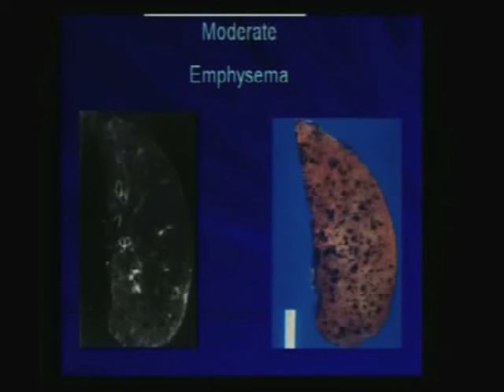And this is a case, for instance, where the patient passed away, and the chest actually looked normal. But if you look at the specimen, look how much pulmonary emphysema. So if you look at grading this, you would grade this as 50% involvement, obviously subpleural blebs. But you cannot wait for just the overexpansion of the lung parenchyma to call it emphysema. You have to be able to detect the earlier changes of centrilobular pulmonary emphysema.